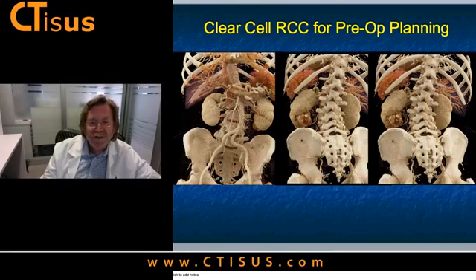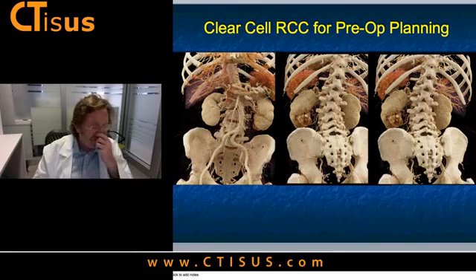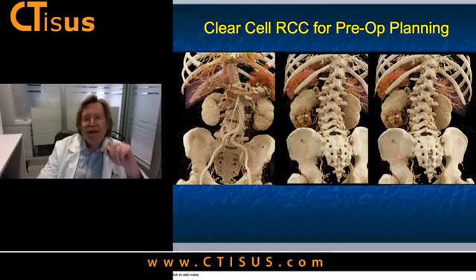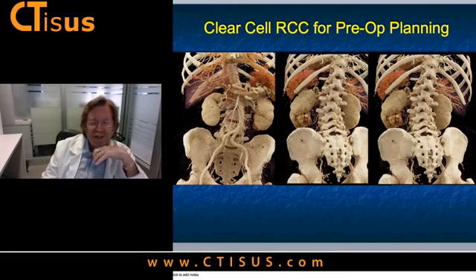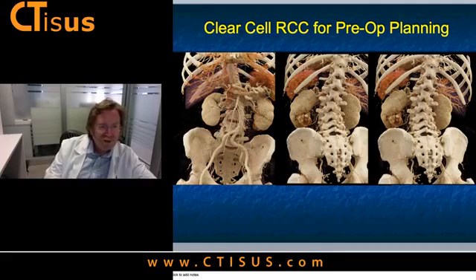Now, one of the things to remember, and I do forget to remind people of this, is that we do not do any special data acquisition for cinematic rendering. We don't raise the dose. We don't do anything special. We don't change the slice thickness. We don't change the algorithm. So it's basically everything we classically use in terms of imaging. So it's our routine protocol.